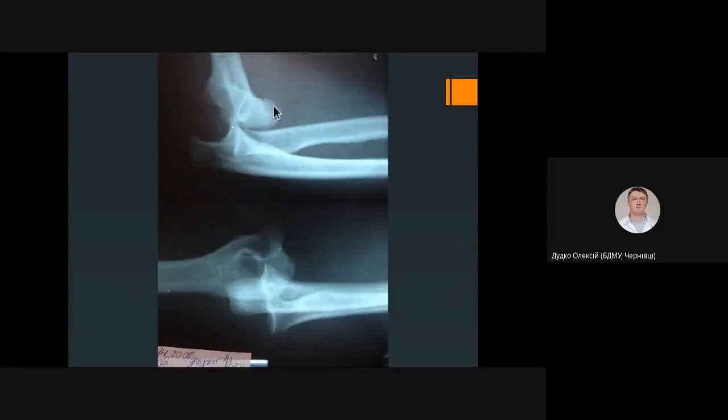These are humeral condyles. Distal part of humerus is slightly rotated. If it is a straight lateral view, both condyles form one circle. Here we see also distal part of humerus. These are articular surfaces.